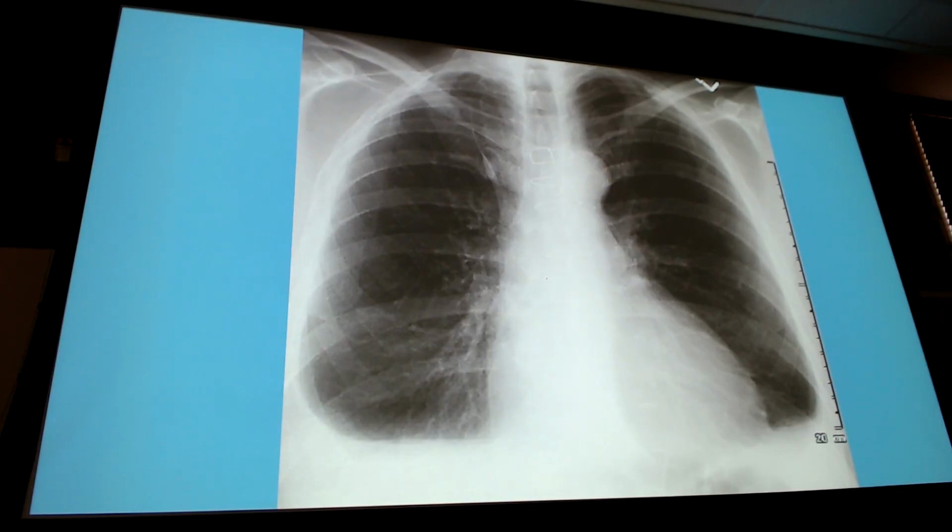Atelectasis. So this is a very small subsegmental atelectasis sitting right up in here. Small, not pulling structures over yet, so it's an indicator. We're trying to distinguish between an atelectasis or a big pleural effusion, but it doesn't have to be that way. So yes, this is a small atelectasis sitting in the right upper lobe.